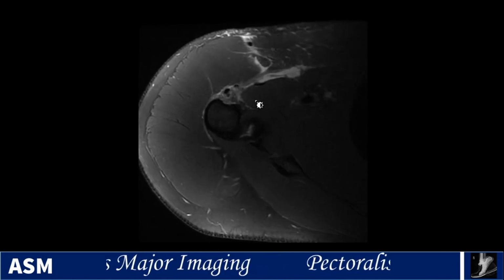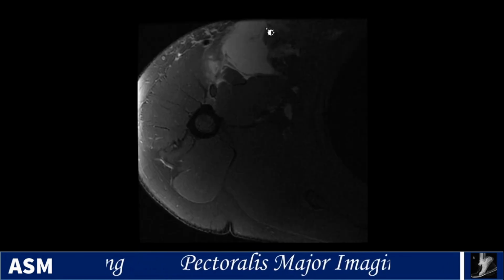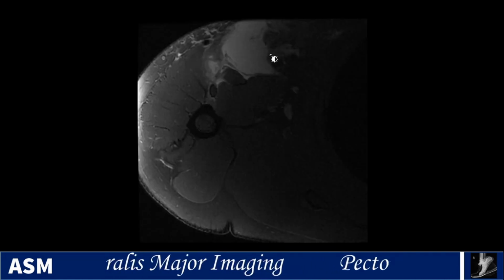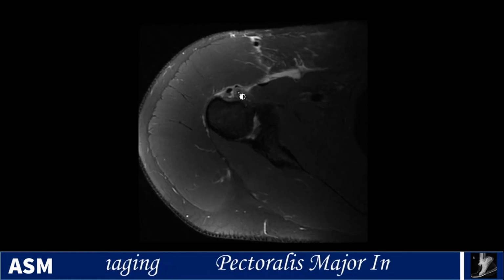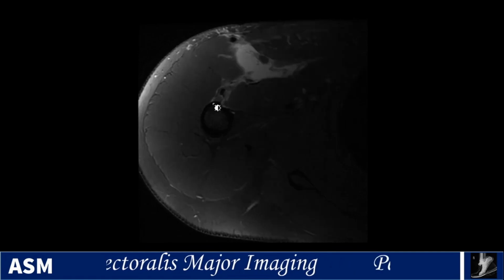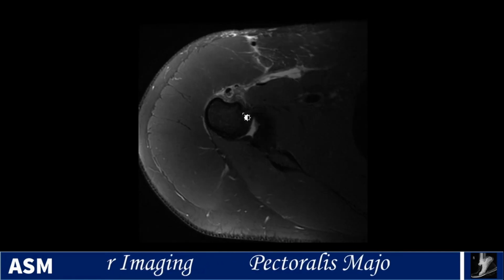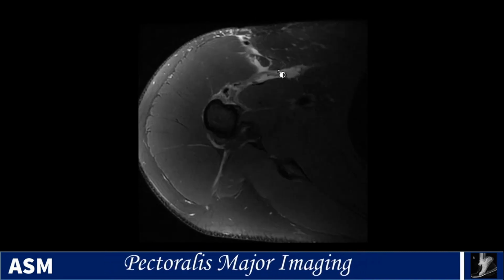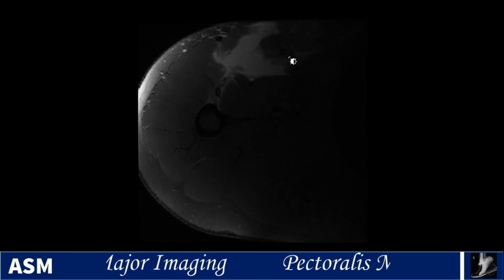And one more case here. We see a large hematoma right here, disruption of the normal muscular architecture with this intervening blood products and edema. The biceps tendon again elevated away with lots of fluid around it, and we have no evidence of a tendon coming in and attaching. You do see the latissimus dorsi, so you don't want to mistake that for your pec tendon, but there's no pectoralis major tendon coming across here. And you may start to see some of that retracted tendon back here.